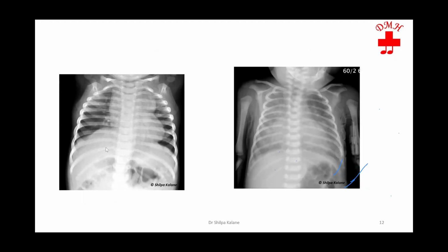Okay. Now what about this X-ray? The first one. First X-ray. Okay. TAPVC, figure of 8, TAPVC. Excellent. Very good. Why is this a figure of 8? It's a supracardiac TAPVC. This is a figure of 8 because the right border is the SVC, the left border is the vertical vein, and the upper border is the brachiocephalic vein. So that's why it is a figure of 8.